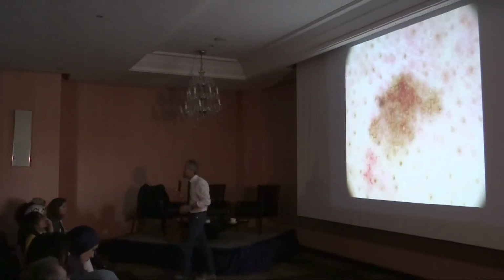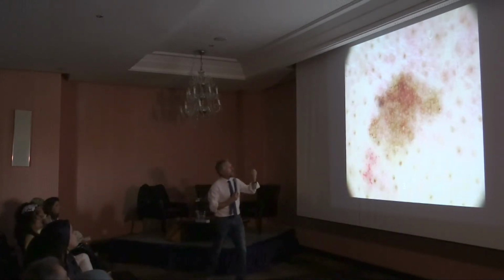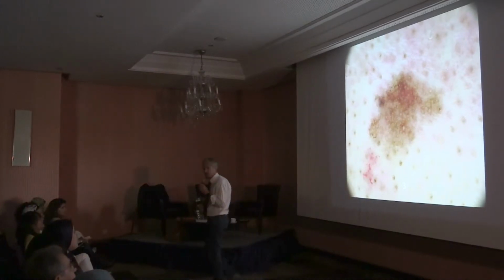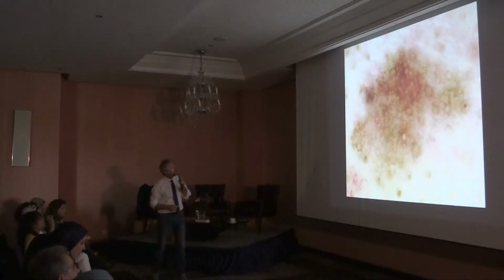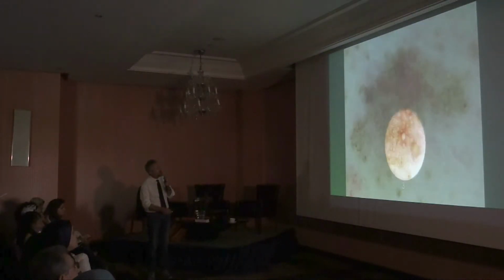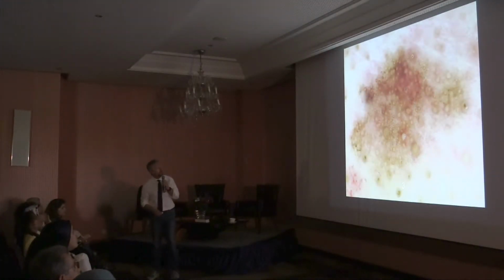We are on the face, right? Okay. What are the benign features you see here? White follicles. Okay, I see one white follicle. How many others do you see?